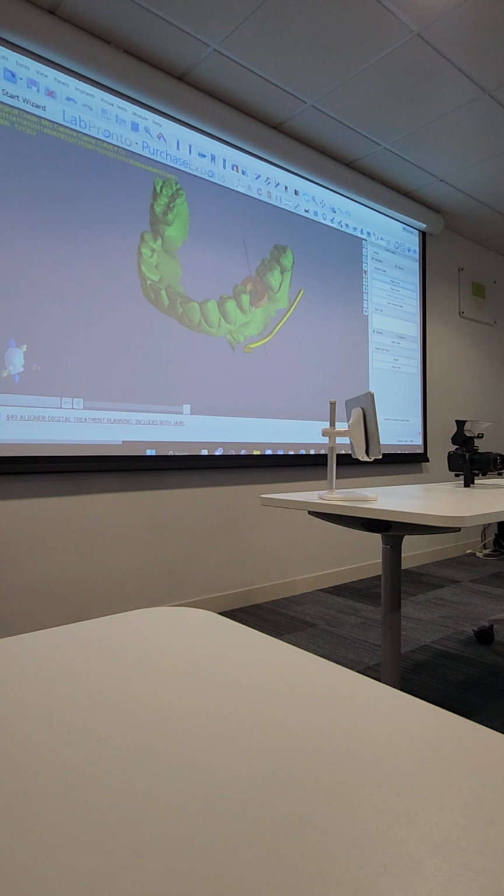Here, we want to make a guide. It's the lower arch, draw curve. Press draw curve. And then, obviously, you want support on either side of the implant sites. I start from the back here. Press and hold shift.